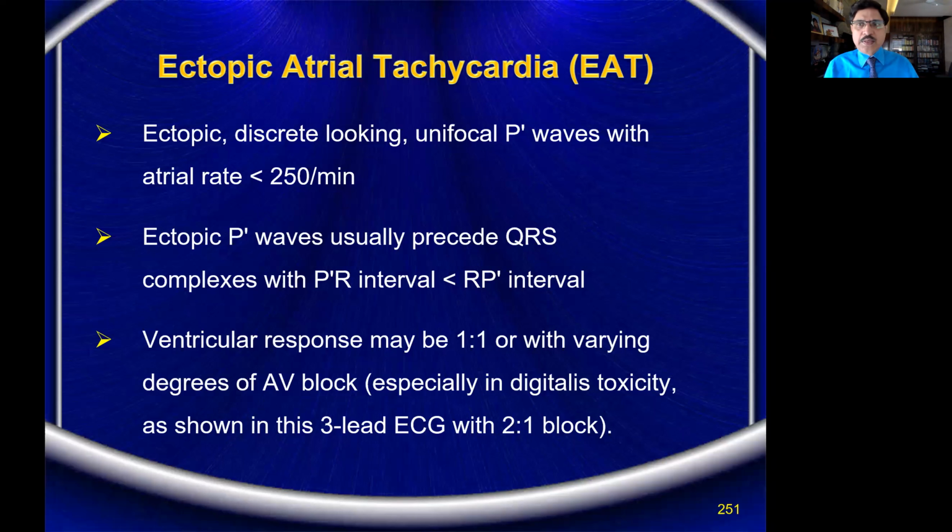So C is the one which is already beyond the AV node and both the bundles. So it gets conducted as a normal beat.